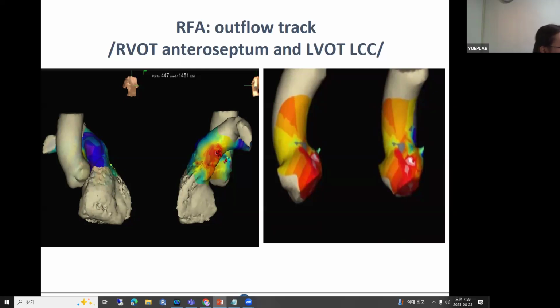Okay, you go already into the cusp here, then between the two. And the right also looks like a little bit early, and the left is early. So I wonder whether you mapped the intercuspid space or not in this case. Something you need to think about.